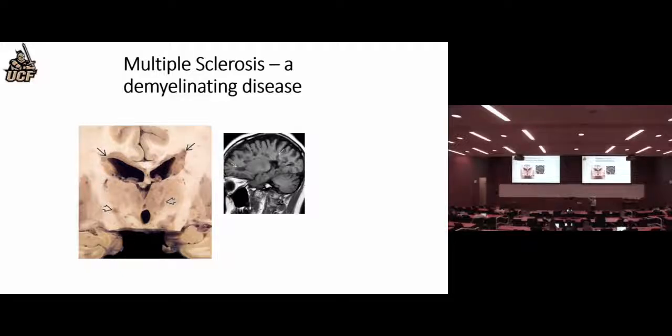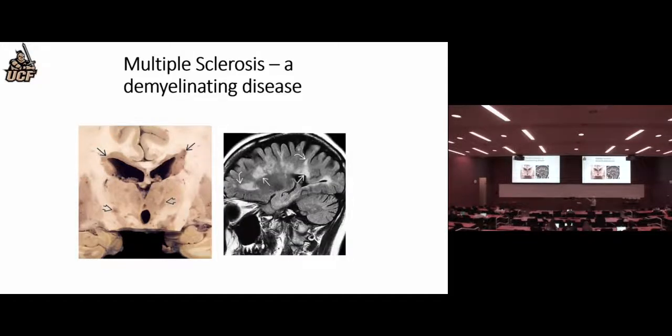There, you can see, and this is a T1 scan, and they would look sort of dark on that. They're much easier to see on T2 scans, however; they look very bright. In fact, this is probably a flare, because this is probably fluid in the ventricle that looks dark, and so you can see all this stuff. To me, it looks sort of like clouds or puffs of smoke or something like that. And that's a very characteristic pattern.